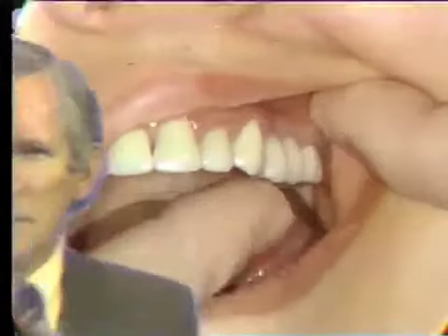I hope it is obvious from this presentation the role of the laboratory technician and the role of the dentist in the preparation of the laboratory material. The dentist has a responsibility for the final aesthetics of the case. They know the patient, they've seen the patient, the laboratory technician has not. So therefore the dentist should make the final corrections for aesthetics of the case. Also, the contour of the tissue is the responsibility of the dentist. The dentist can try the crowns back in the mouth, can adjust the contours of the crowns according to the gingival tissue to make it more compatible with the gingival tissue.